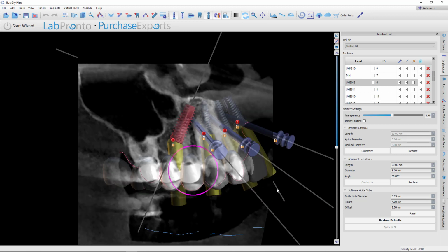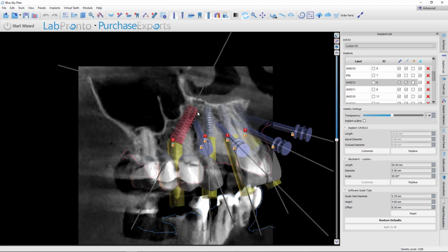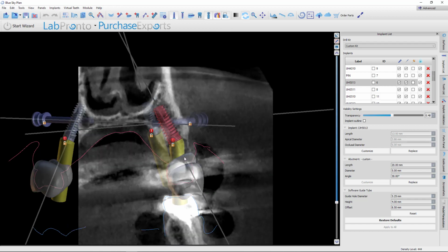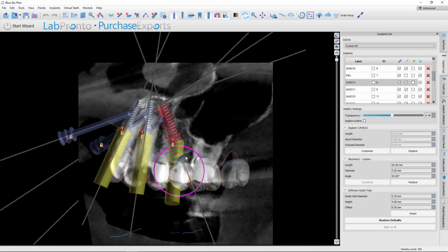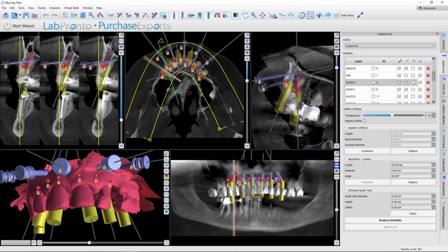Now, if you'll also think back, we wanted to lengthen her teeth upward. Okay, so that means that we're going to have to do some bone reduction to move that transition zone up. And so we've got the implant about as deep as it can go. This is the nasal floor. This is a 30-degree abutment that's been placed on here. And so you can see the positioning everywhere. Let's go through the others.